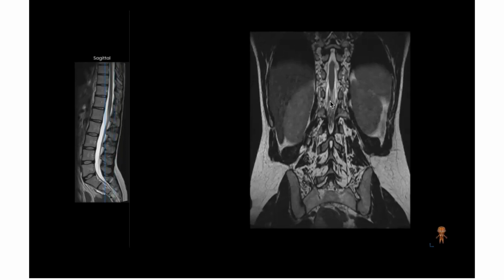What is happening here? Here you can see the spinal cord. You can see the nerves. Why? Because of the lordosis. Because of the lordosis, we are still in this part, but here there's a kyphosis. So that's why we have reached the spinal canal level in this part. So that's why we can see over here the spinal cord, and we can see the individual nerves over here.